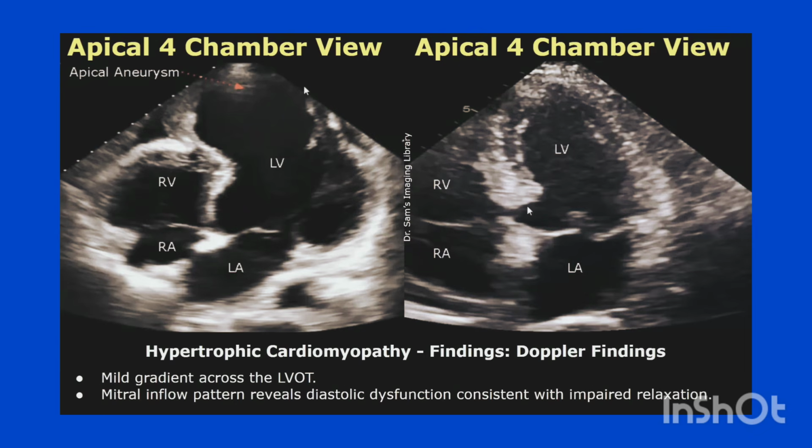These are the Doppler findings: mild gradient across the LVOT. Mitral inflow pattern reveals diastolic dysfunction consistent with impaired relaxation.